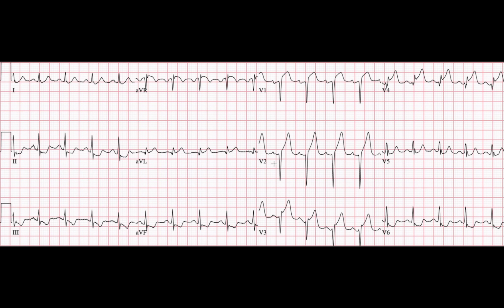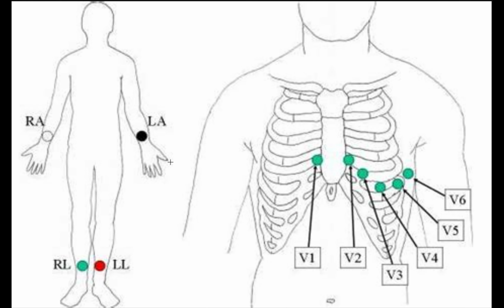You've all been waiting for the answer to this case study I put before you about this 32-year-old male who presented to the emergency department with severe chest pain and shortness of breath. So maybe some of you are looking at this and wondering, what are all these squiggles going up and down, and what the heck is this thing? I thought it'd be good if we took a little look at what a 12-lead EKG is.